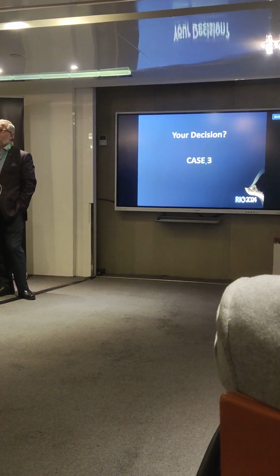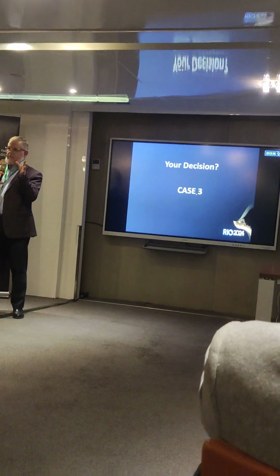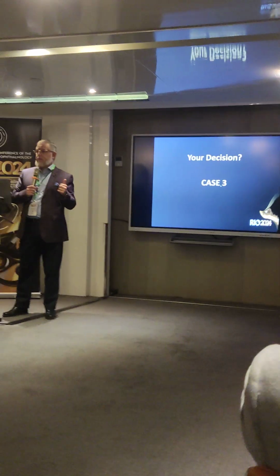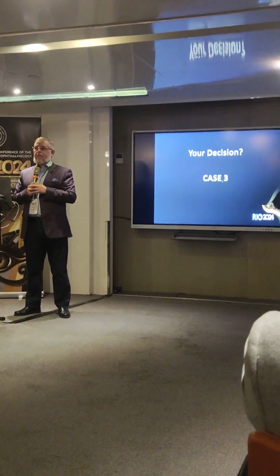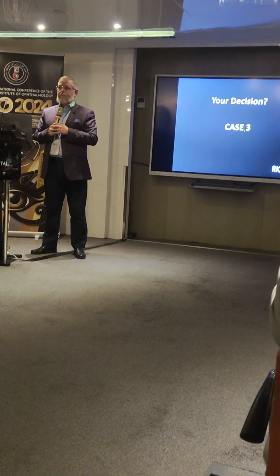Very tolerant. What is it? Mini Well, Mini Well. Is it an enhanced monofocal? Yeah, it is EDOF, yes. It is EDOF. Its spherical aberration is negative? Yes, and it works on the concept of a combination of spherical aberrations, fourth and sixth order, opposite sides. It gives a depth of focus, and it's a very tolerant lens in these cases.